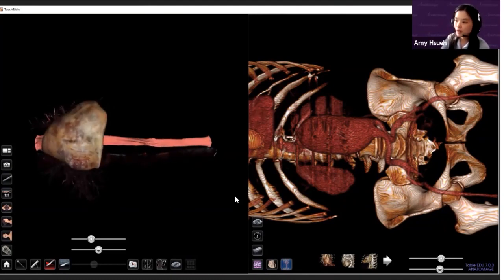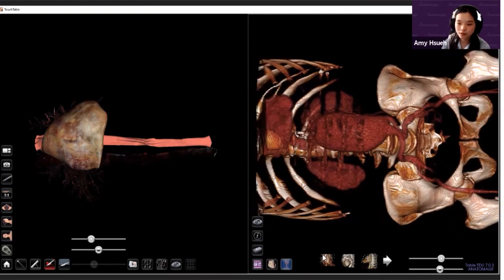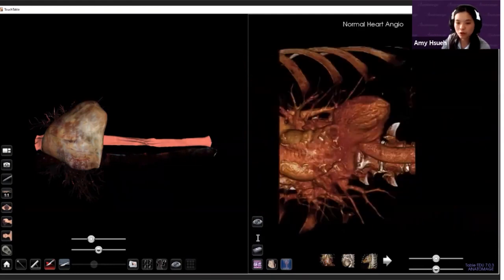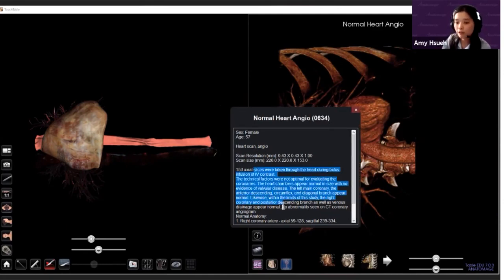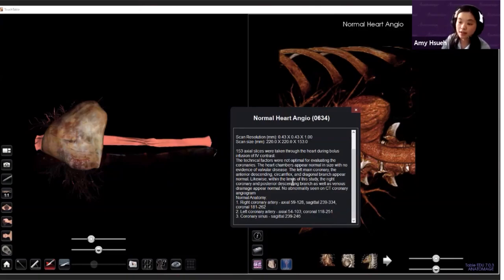Okay, and that is everything relevant to our case library. The very last thing is that this eye icon is also available. If you happen to jump upon a case that you're not familiar with and you would like to know more information about it, this eye icon over here will bring up all the information that we have available. You can see the case number and all the information that we have, and so you can easily find it later on in the future.